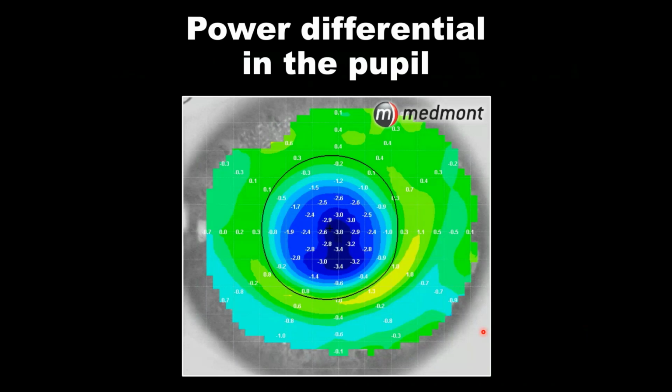We can use the numeric meridian map on your display window. So if you go to the display pull down and then check the box that has numeric meridian next to it, then it'll create this image. And I only use this when I'm doing a myopia control analysis. I generally don't like the clutter of all these numbers on the window, but some practitioners like to have the data on the radius of the eye from center to periphery, and certainly for myopia control analysis, this has value.